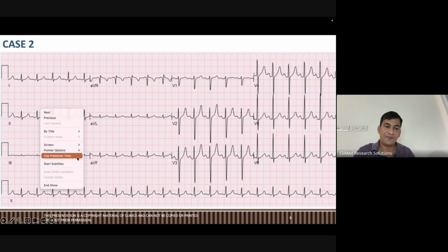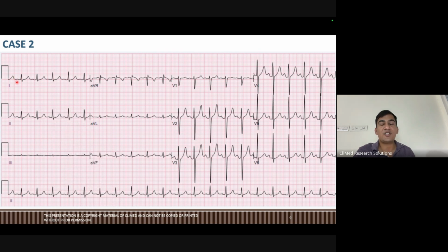Let's start from the first wave, I mean first rhythm. If you check, this is a pattern. This is QRS complex. After QRS, T. After T, there will be P wave. So here you can see a visible P wave, a simple P wave. So this is a normal rhythm, right? There are no 3 or 4 waves, only QRS complex, then T, then it starts again with P, QRS complex, T.